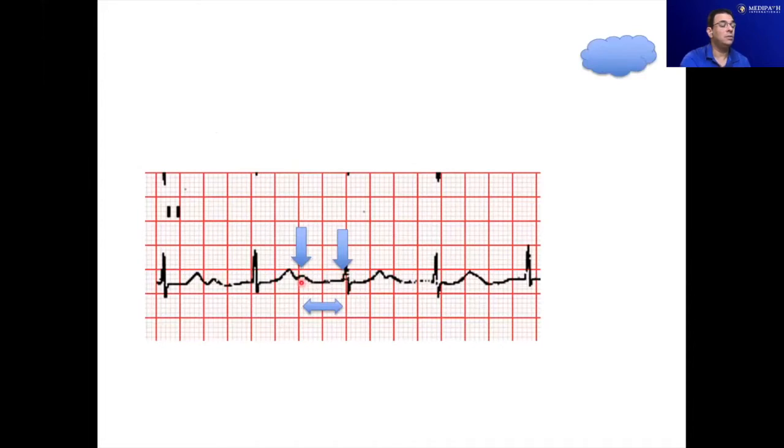As you can see, this is almost 10 boxes. So this would be about 400 milliseconds. And it's consistent. Every P wave should be approximately the same distance to the QRS. As you can see here, it should be consistent. It should happen everywhere. This one, actually, the P wave is embedded in the T wave. So you may want to look at that.